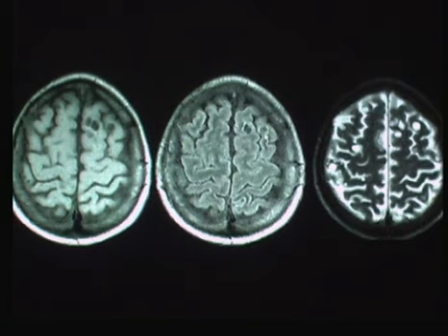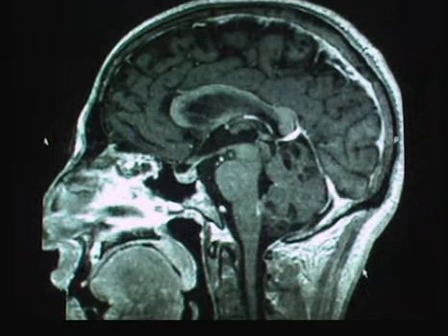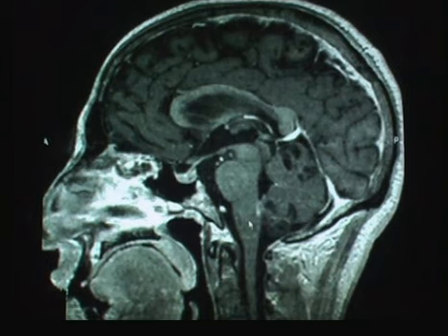You might argue, is there a small scolex or an area which does not look cystic here that might make us think about neurocysticercosis? Here's imaging from the same patient, and here in the sagittal we see multiple parenchymal lesions within the cerebrum and cerebellum, but there are also small foci of enhancement here within the subarachnoid space.